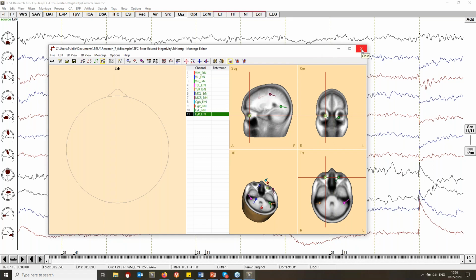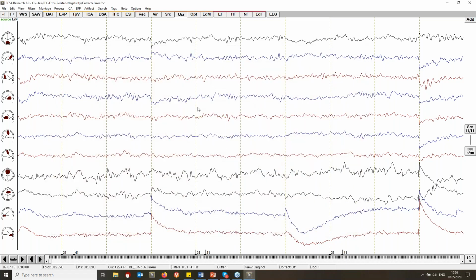So this is the source montage, and you can see how the single trials are now transformed to the source montage here. The next step is that we want to define the paradigm for this.